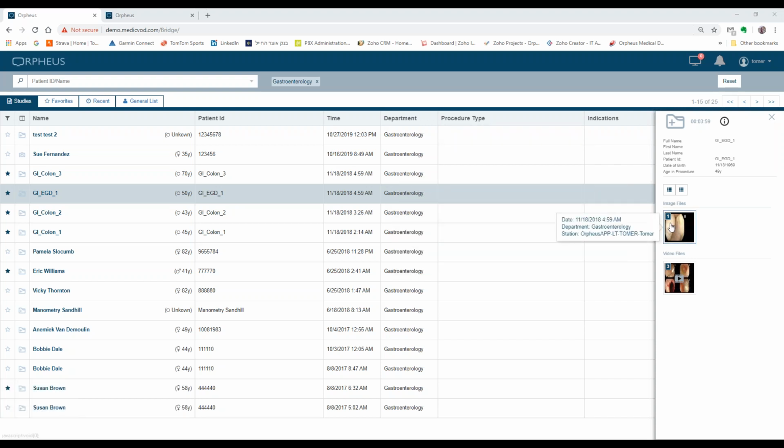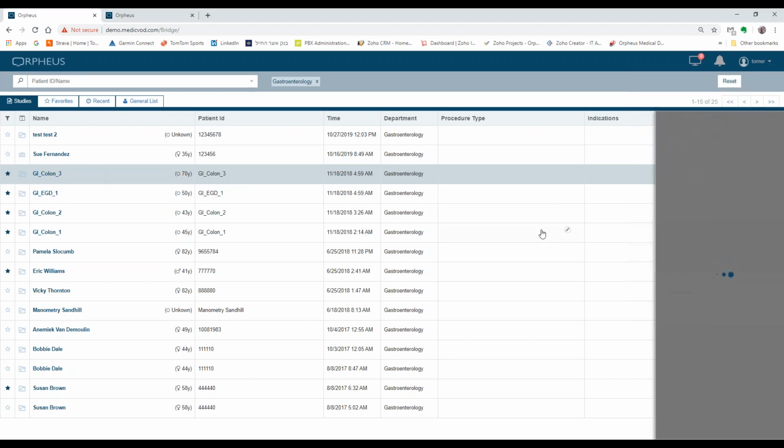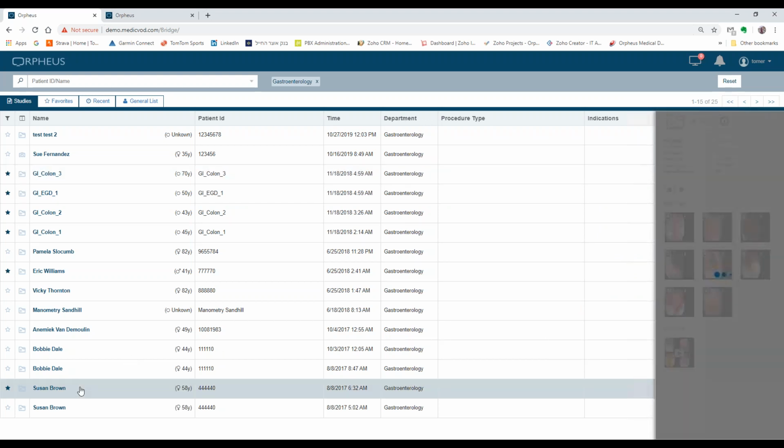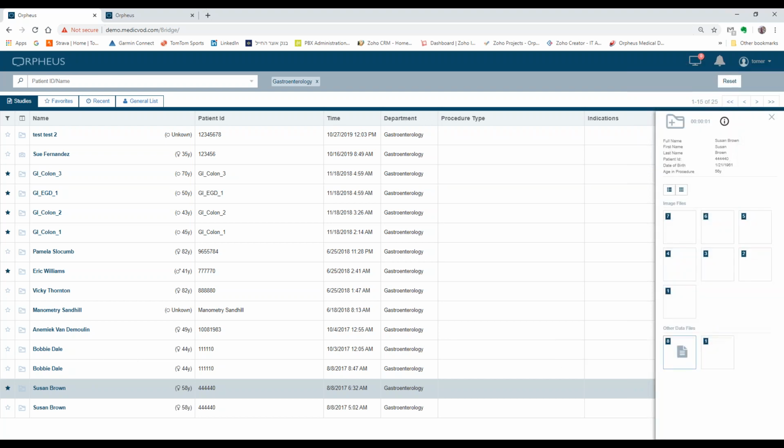So just to give you some examples of how this panel looks, you can see here when there are multiple media types, and this is your typical situation where you have images and videos, then they will be separated into those sections that you see here in front of you. A list of images, and then of course the video section with potentially a list of more images and more videos.